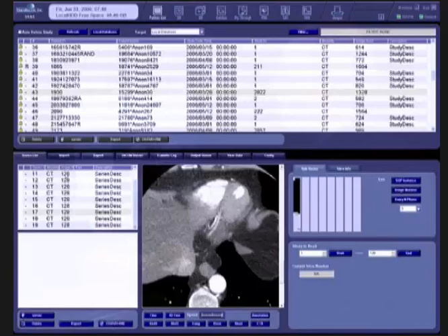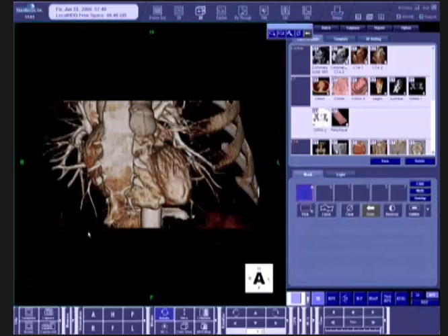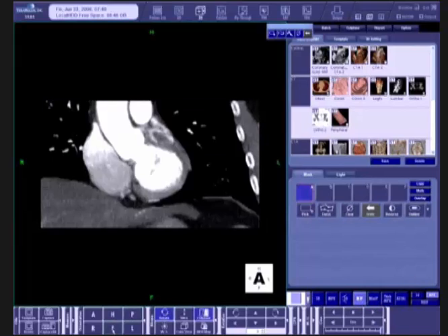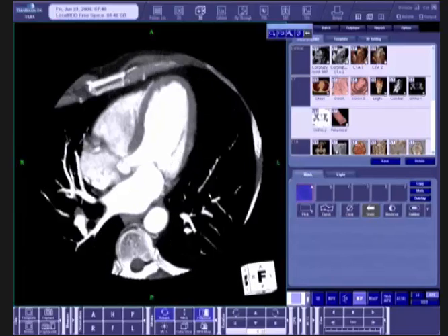The next thing I'll do is to then look at this in a 4D mode, looking at ventricular function. Once the images are registered, I flip into a maximum intensity view, roughly getting an image that looks somewhat reminiscent of an apical 4 or 2-chamber view that we would obtain through two-dimensional echocardiography.